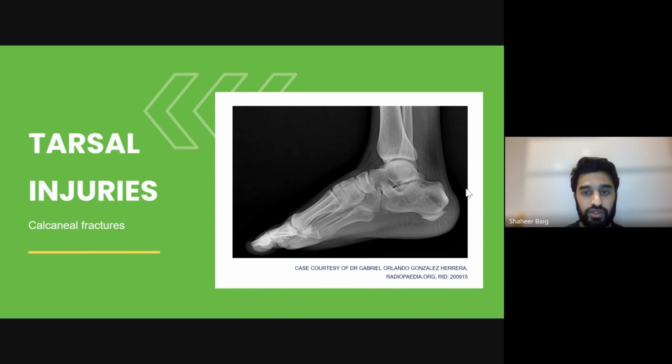One thing to note is, usually due to the mechanism where you're landing flush on your heels, the axial force projects through the body and into the spine, and it's a good idea when you spot one of these calcaneal fractures to recommend the clinician imaging or assessing clinically for any spinal fractures, particularly around the T11 to L1 region, which can accompany these injuries.